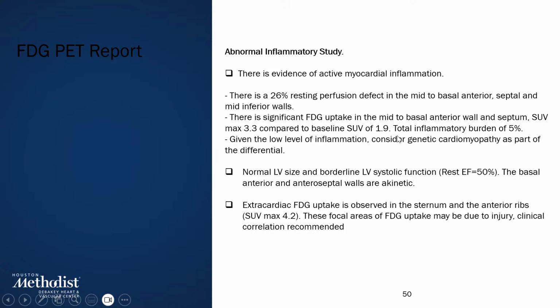And whilst there was uptake in those areas that correlated well with late gadolinium enhancement on cardiac MRI, it was still thought to be lowish grade SUV counts, which is definitely abnormal, but not in the range we would expect for acute active inflammation, but has been more often seen, especially in our lab, in patients with genetic cardiomyopathies, whom we know could have that pattern of late gadolinium enhancement as well as undergo phases of active inflammation in their areas of genetic cardiomyopathy scar.